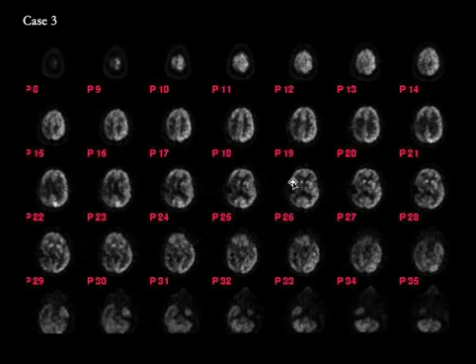So the resection cavity is expected to be photopenic. The margins of the resection cavity are also expected to be photopenic, which they are not. There is linear increased uptake around the margin of the resection cavity, which is consistent with tumor recurrence.